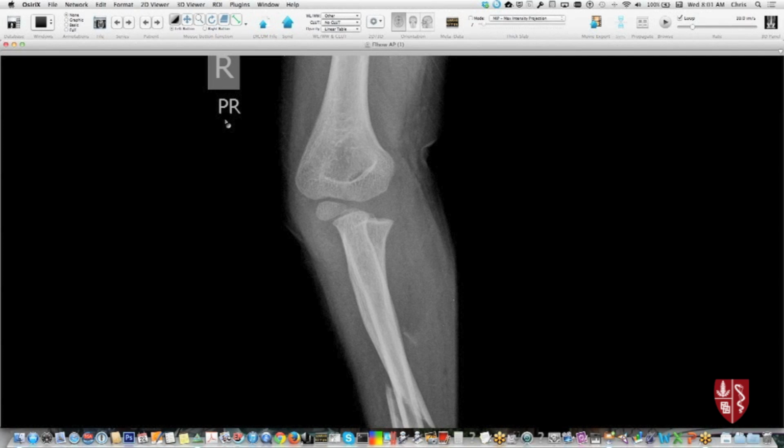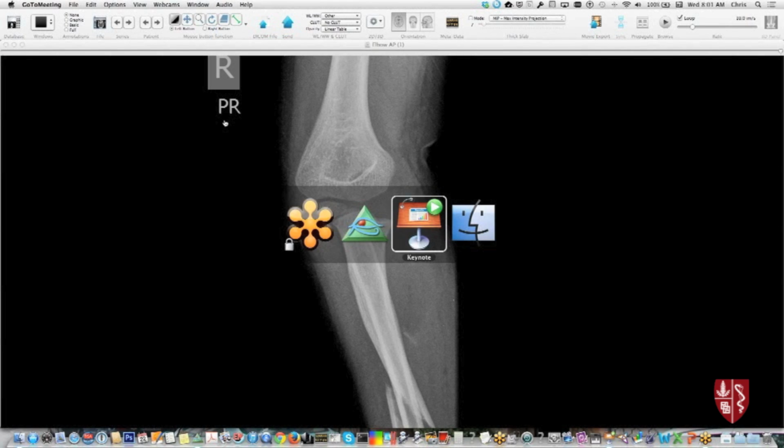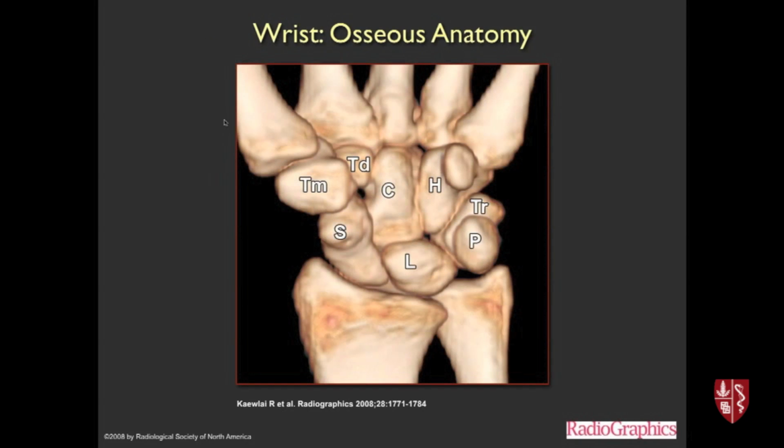Okay. Let me switch over to the wrist slides here, and we'll finish up with that. So I've given full lectures before on wrist and hand, and I can't really get through all of it.